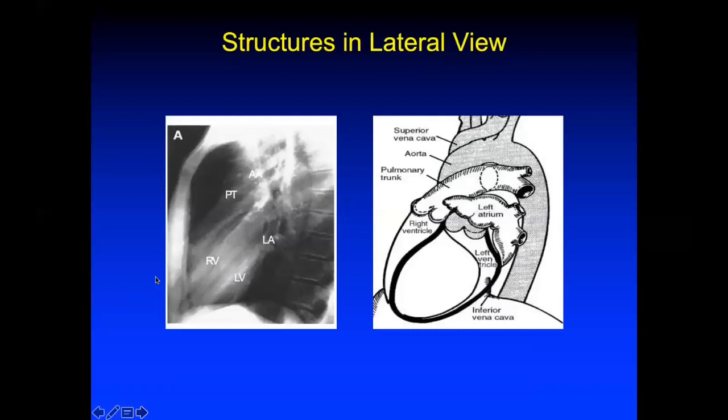Sometimes, though rarely nowadays, you are given a lateral view, and some examiners might give you a lateral view of the X-ray. So you should know how to approach a lateral view. In a lateral view, anteriorly is the sternum, and these are the thoracic vertebrae. As we move from the upper end of the film to the lower end, the radiolucency increases, that is, the lung field becomes darker. This is because there are more air spaces in the lower lung fields. This is how you identify the anterior and posterior aspects.